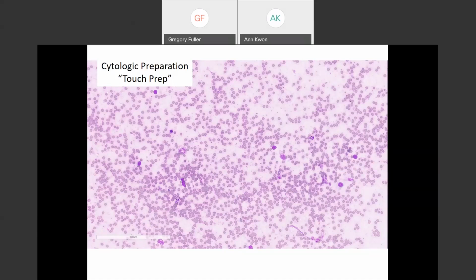Do a smear also. Listen, there actually is no law, and I believe this is not just the United States, I believe it's international, against doing two types of cytologic preps when you're called for intraoperative consultation. Do the touch, then do a squash, do a smear, do a drag. Do two. Do whatever you have to do to get the tumor on the slide. And there was no excuse not to have a beautiful smear of this tumor and nail that diagnosis of ependymoma right off the bat. These are red blood cells.